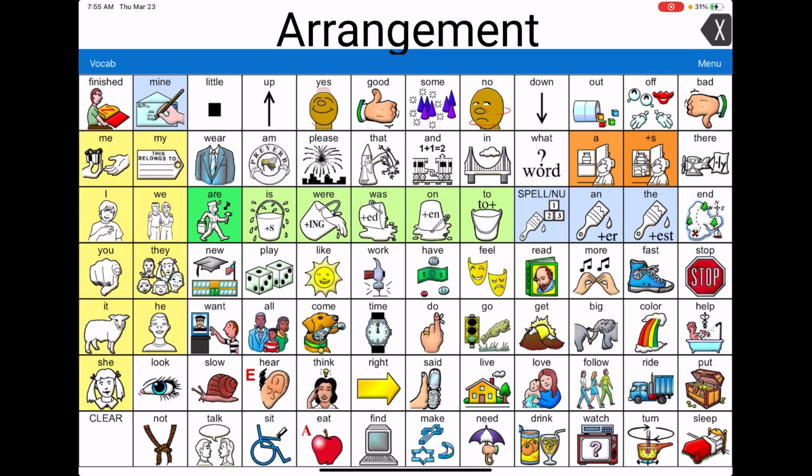When we look at the arrangement of LAMP, you see across the top row some buttons that are mostly white. The color of the background is significant in this application. The case of the words that are typed is also significant.